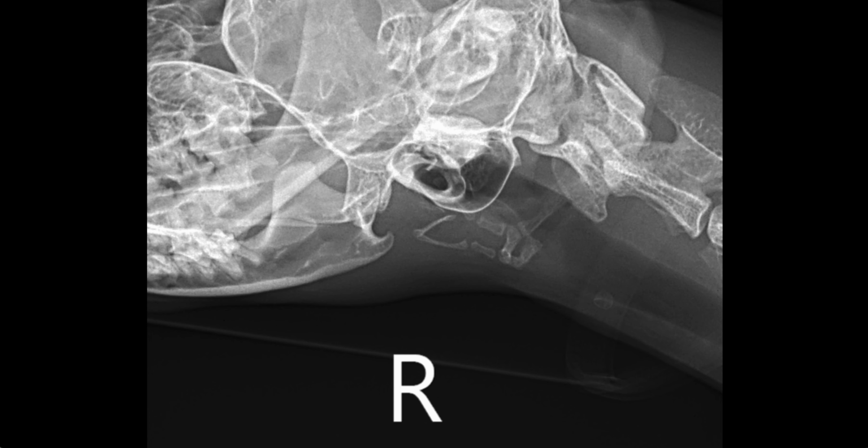This month's theme is Skulking Around. We will be focused on skull radiographs. A complete series would include a VD or a DV view, a lateral and oblique views. Skyline views of the sinuses can help characterize other aspects of the skull and the contents of the sinuses.